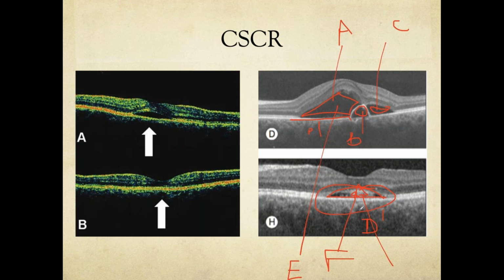Now, if the same patient has a fully blown, large scar, which looks like a choroidal neovascularization membrane in the left eye, and has something similar in the right eye, this could be a very early phase of age-related macular degeneration of the wet variant, right? So it could be many findings.